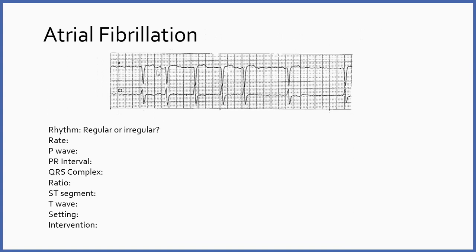All right, this is our last slide for preclinical lab, and it's atrial fibrillation. Now, with atrial fibrillation, the SA node is no longer in command of the heart. Fibrillation, that word, means quivering, and it's caused by rapid discharges from many irritable foci in the atria that are rapidly firing all at once. That doesn't work so well, and the resulting rhythm is erratic and uncoordinated. If you could look at the atria, you would see that they're just quivering.